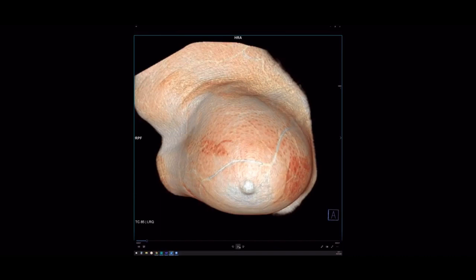and the reason why we did this CT is that the patient got an MRI in another institute a few weeks before, and they said, okay, you don't have to worry. There's only a maybe benign lesion in your right breast at 3 o'clock. It takes some contrast, but it seems benign. So it's a BI-RADS 3 and you can come back in 6 months.